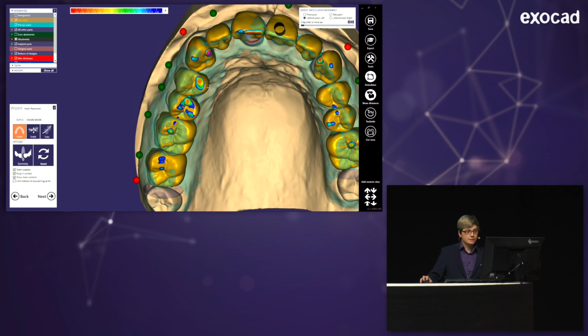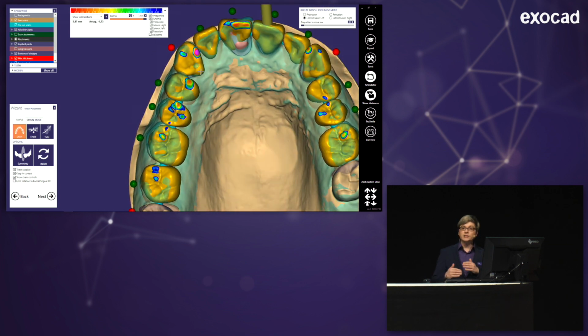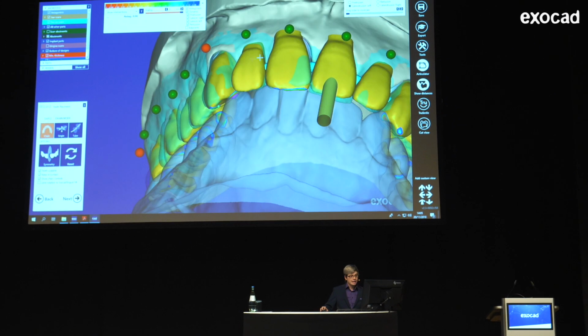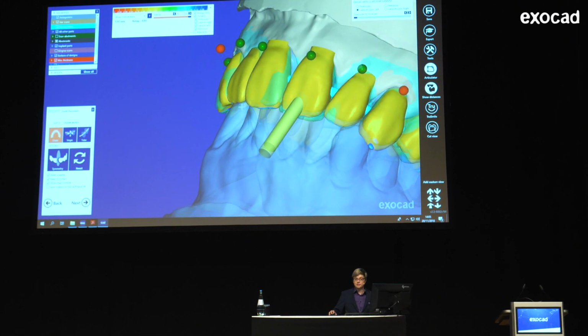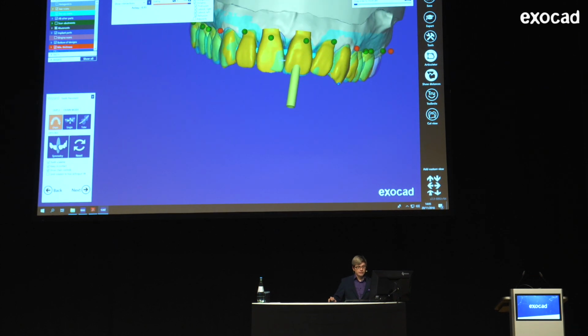You see the contact points here. They're activated as dynamic. Because I use the virtual articulator, I can activate it. And so I see contact points for every kind of movement the virtual articulator could make in that instance. So I can really orient myself. Because as you might see, actually, there's no contact to the antagonist now, but there will be if I move the antagonist. So for now, I think this is OK. The anteriors still look bad, to be honest.